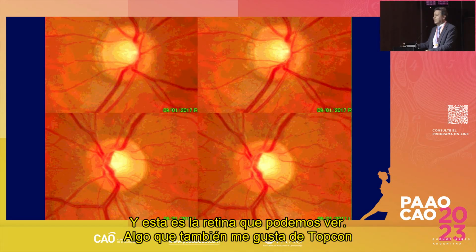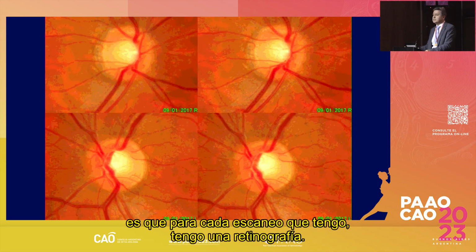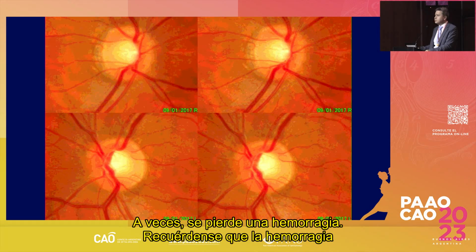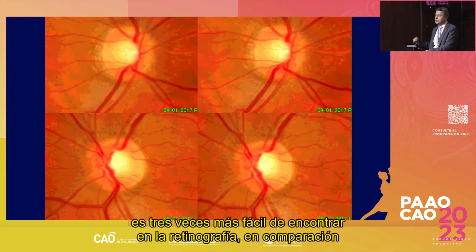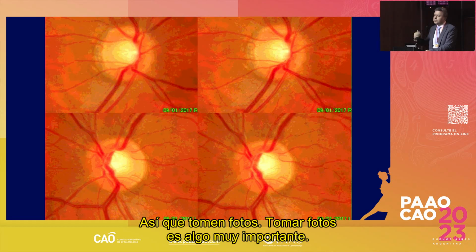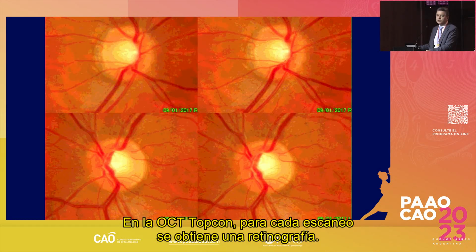Something that I also like about the Topcon is that for every scan I have a retinography. So sometimes you just miss a hemorrhage. And remember that a hemorrhage is 3 times easier to find in the retinography compared to a glaucoma specialist using the lens looking for hemorrhage. So take pictures. Taking pictures is something very important. And for the Topcon OCT, for every scan you have a retinography.